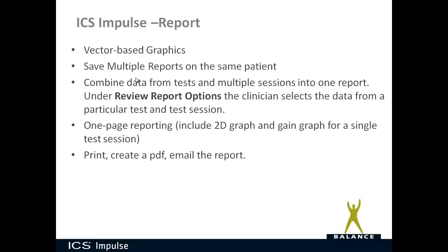So again, to reiterate about the reports, there's still vector-based graphics, and this is great because you need vector-based graphics. They're the quality that you need for publications. So if you're publishing your data, then you've got the vector-based graphics. It saves multiple reports on the same patient. You can combine data from tests as well as multiple test sessions into one report.